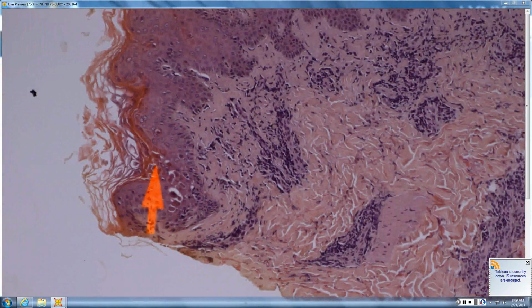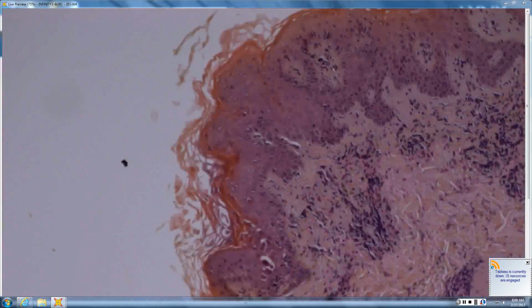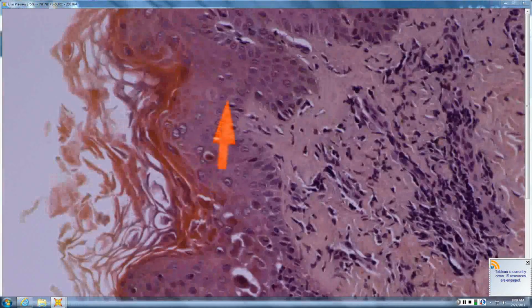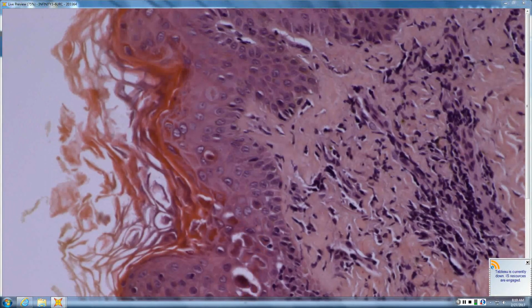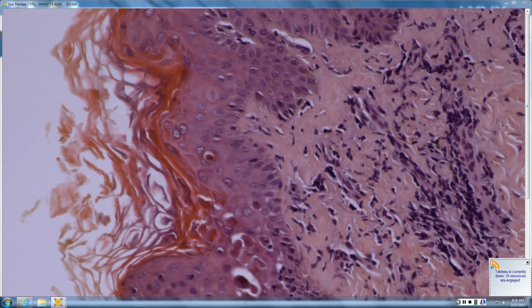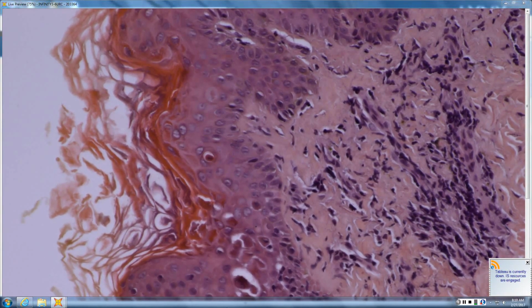Those are some inclusions. I see a red rim around the nucleus. I see cells that are larger, dyskeratotic, and acantholytic. So why is there a little focus of acantholytic dyskeratosis and also herpetic change? And this is someone who now is head to foot, kind of blisters and sores.